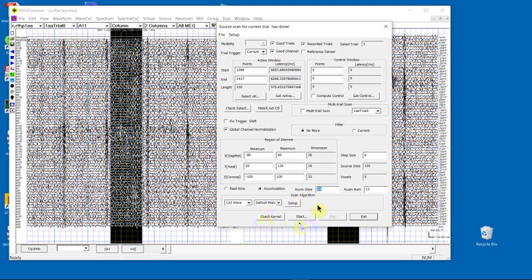Once you have set all those parameters, click Start. And then the program will show you the information. For example, this shows the program is preparing for imaging, function, no activity. Here shows how many segments. This is a voxel. We go through all slices and all voxels. Once we click Start, you just wait.